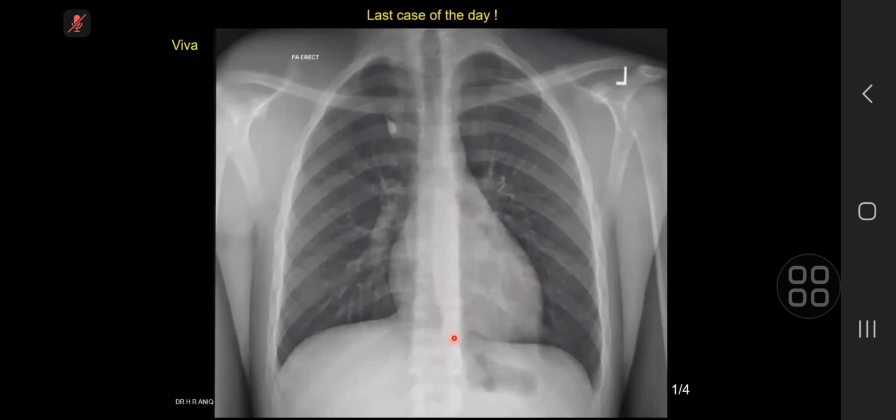So I'm looking at the remainder of the lungs. There's no consolidation or collapse. Incidental note of an azygos fissure. So I'm reviewing the bones. I can't see any abnormality in the clavicles or the proximal humeri bilaterally. The glenohumeral joints appear to be preserved. Looking at the ribs, I can't see any destructive rib lesions.